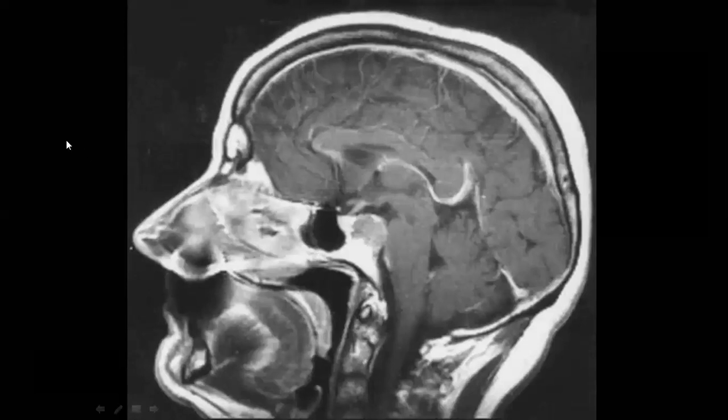So what about this image? Let's shift more and more. Yeah, I feel that you want to say that there is something. This is the clivus. So the clivus has something here, and has this lesion, right? So what could be the differential? Yeah, I feel that you want to say chordoma, exactly.